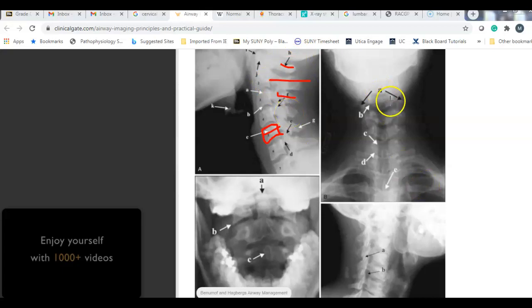Soft tissue. With x-rays, the denser the material, the whiter it will be, the less dense, the darker it will be. So for example, we have air here. Okay, so this will be the trachea. You want to make sure the trachea is midline and dark. You want to make sure there's nothing in it and that it hasn't deviated.